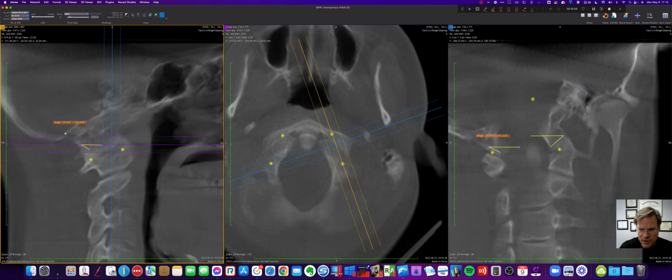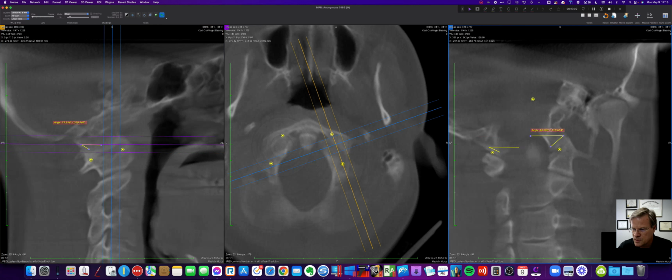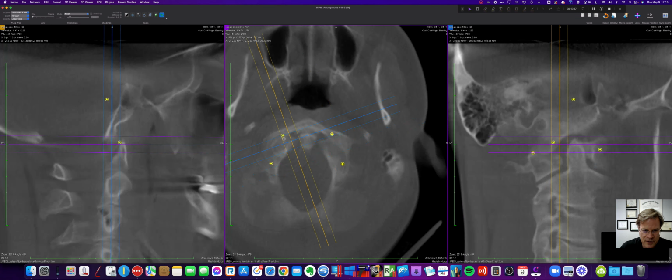I'm going to go ahead and take a picture of that. Boom. Oh, except I didn't keep that in there. So let's get this here. Let's shift and click, and now I've got all three angles. So now we're going to take a picture of that. Now we're going to slide over here to the other side.